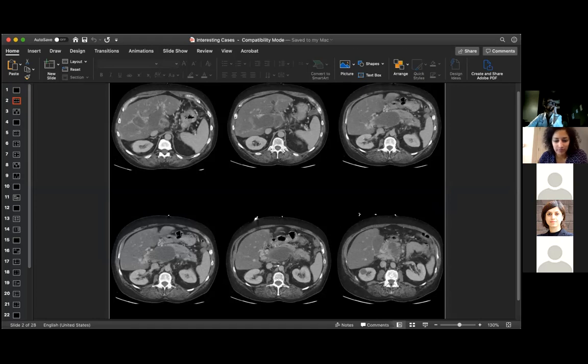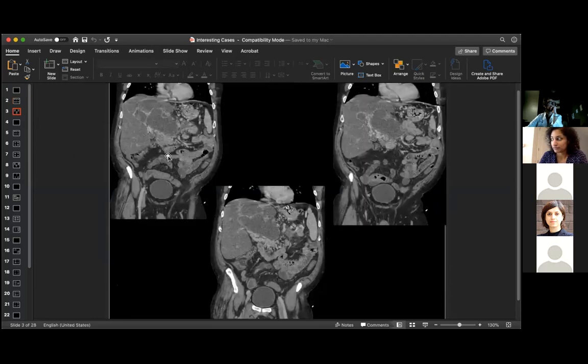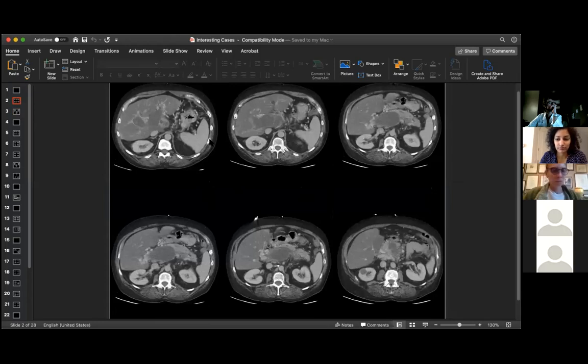Right. Okay, so correct. The abnormality is in the portal vasculature. And we have what looks like cavernous transformation, which is showed nicely here. I'm going to go back to the coronal here. And you can see again here is a ton of vasculature that shouldn't be there. That's what we call cavernous transformation of the portal vein. And so people said thrombus. Okay, perfect. That was one of the thoughts that we had.